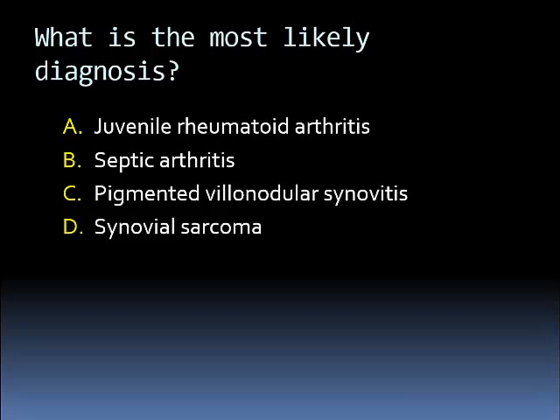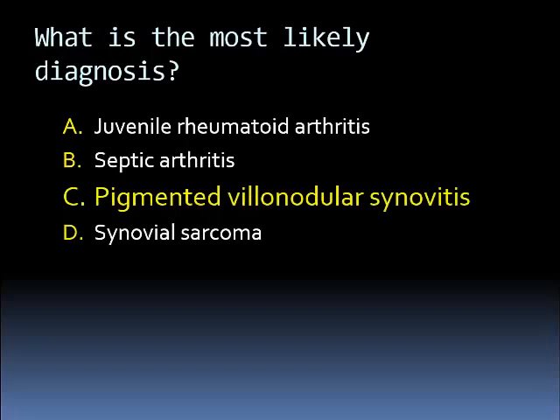Keep in mind that synovial sarcoma is actually not related to the synovium. It's a tumor that under histopathology has a structure somewhat reminiscent of the synovium. There's not a lot of literature related to synovial sarcoma. In our personal experience, we've seen those to be relatively low in intensity and oftentimes just occur in the soft tissues. They don't arise from the joint space itself. This was indeed a case of pigmented villonodular synovitis.